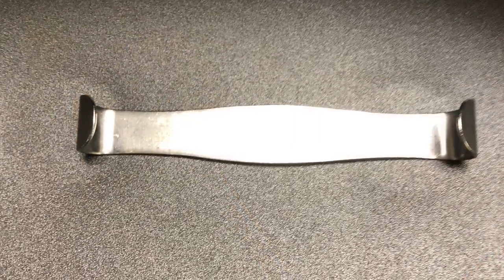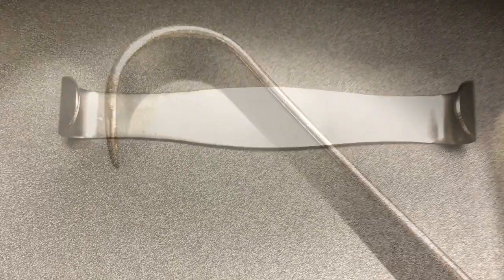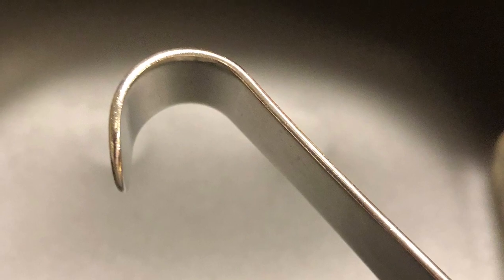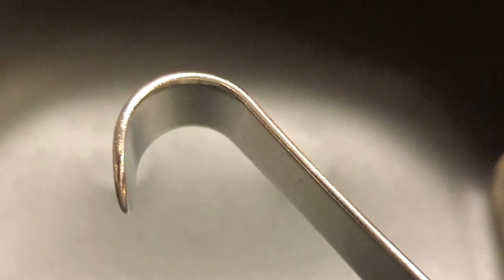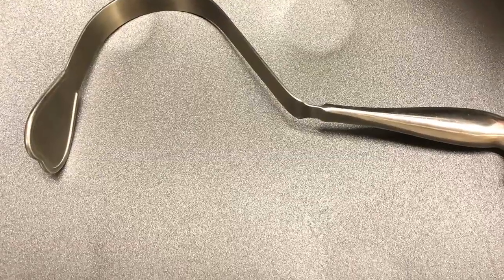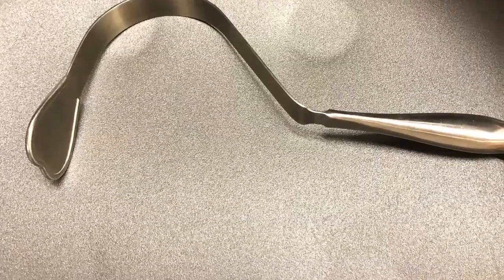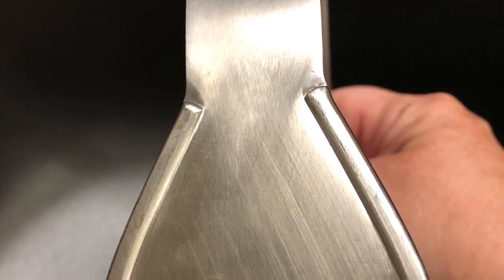The Parker retractor. This is a handheld retractor that allows for holding back tissue. It is double-ended, however, each end is equal depth on both sides. Harrington retractor. This is also called the Sweetheart retractor. This handheld retractor has a heart-shaped end that is designed to reduce retraction trauma to organs such as the liver, intestine, and it allows for deep retraction.